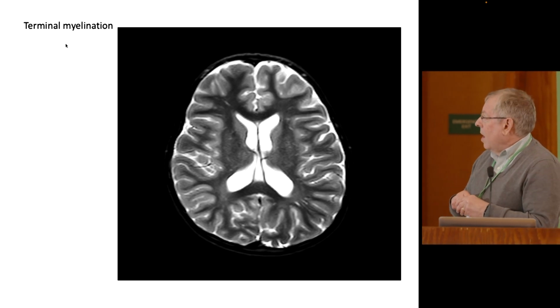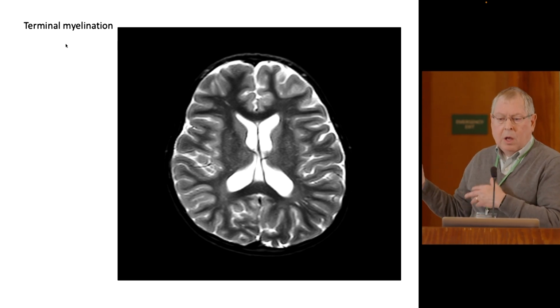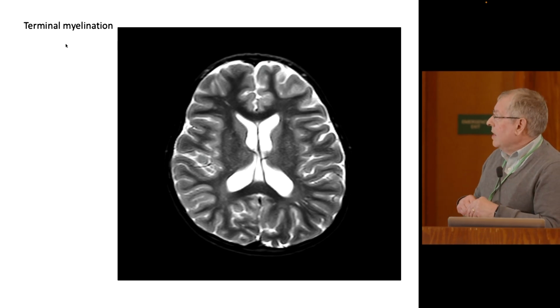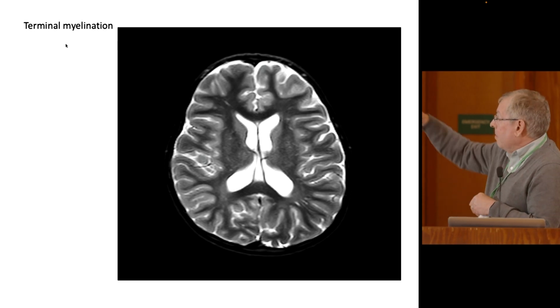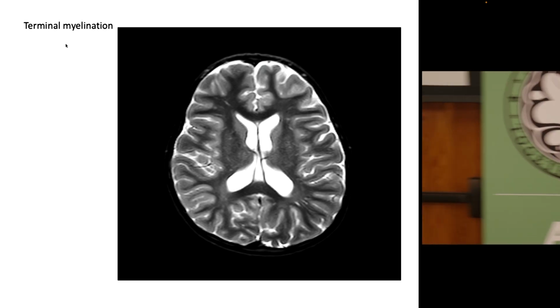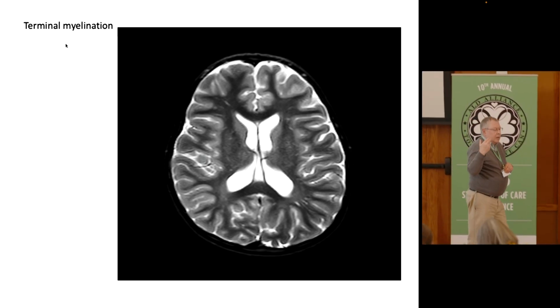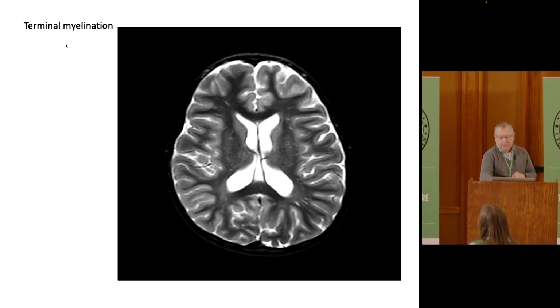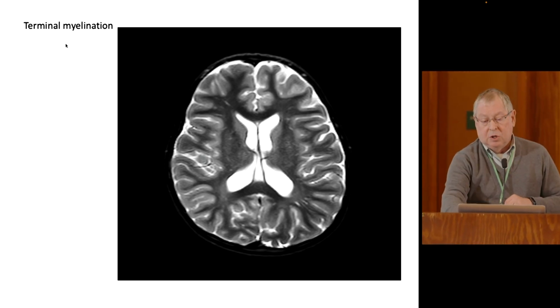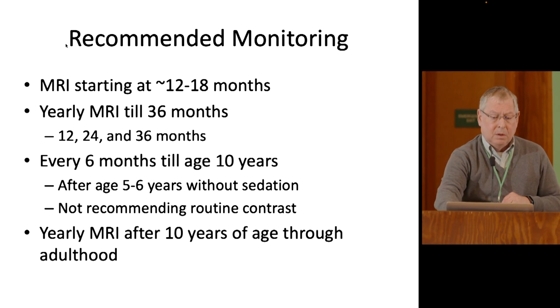When I look at an MRI from an ALD individual who's 1.5 years of age, and I'm seeing that, and they're going, is that disease? I actually focus first on what am I seeing in the splenium, which is the back corpus callosum. Once again, this band here, or the front of the brain, and I'm looking at those things to determine whether I see a lesion where I should be seeing a lesion. It's pattern recognition for many of us.